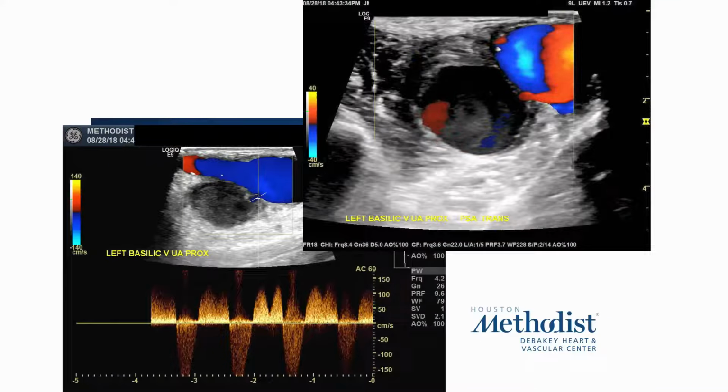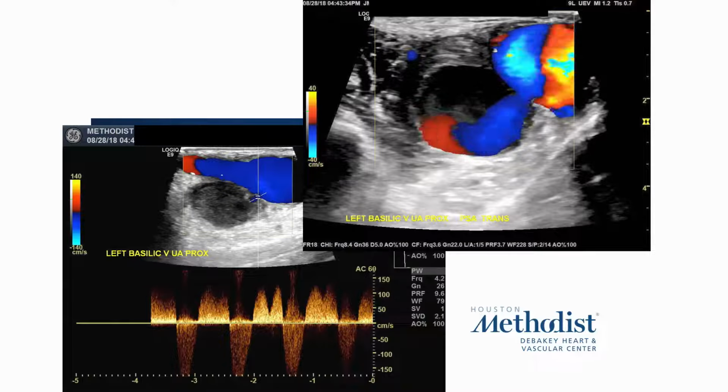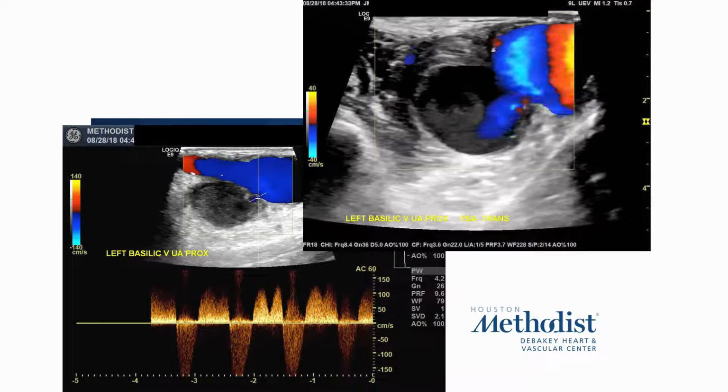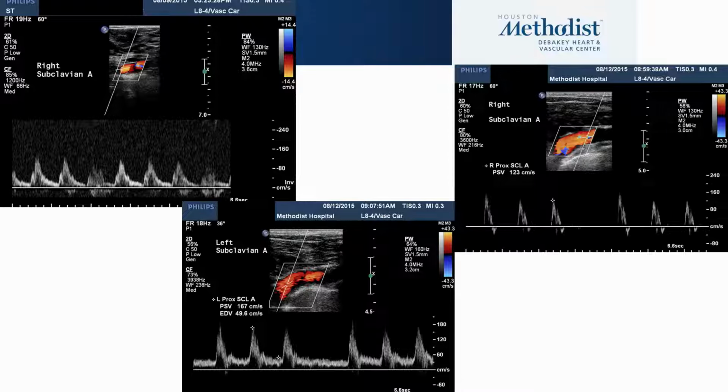But I believe that we definitely can learn a lot in AVF, and why we called it AVF and the Top Gun as a title, because we think without the ultrasound, without this finding, we won't be able to really take care of these AVF studies. And what I can show you is my prediction. So just looking at the subclavian waveform, the normal high resistance waveform would tell me that the AVF is occluded. When I have a beautiful low resistance waveform, it tells me that most likely my AVF is open. But when I have a delayed upstroke, that is pointing me to maybe there is a proximal stenosis.